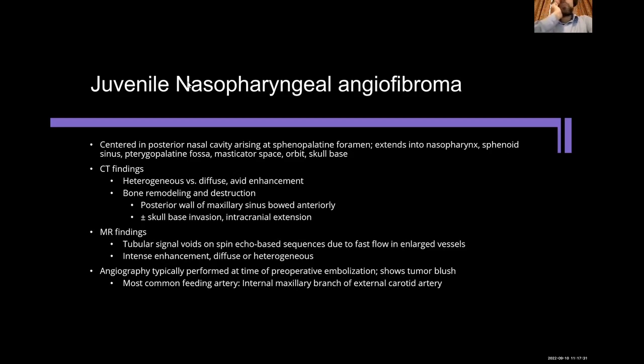You mentioned fungal sinusitis. It is not sinusitis. In fungal sinusitis, the lesion starts from the sinus, and when it is invasive, it invades the bones, but the main bulk of the lesion is within the sinus. The angiofibroma can destroy bone, but very late. It starts with bone remodeling, even at large size.